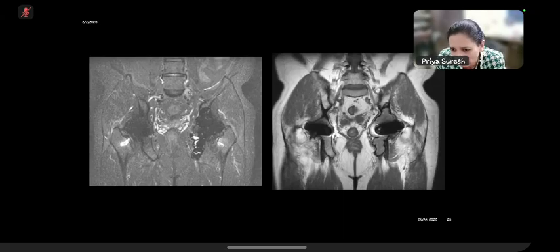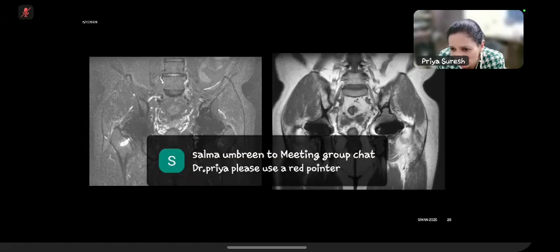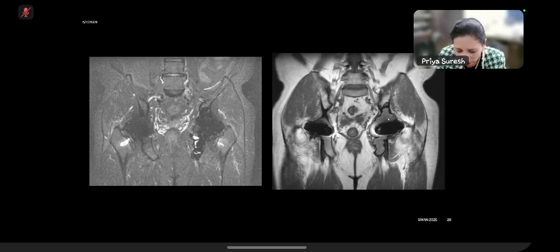Okay, so look at this. You can see it very nicely. So that's the normal marrow, but you can see that there is complete replacement of the normal marrow. So when the surgeon goes in, I went in and saw one of them, and one of the surgeons also took perioperative or intraoperative pictures, and this is literally like completely lysed. It doesn't have any bony substance at all, like black jelly like thing that is replacing this bone. Okay, so that needs to come out.